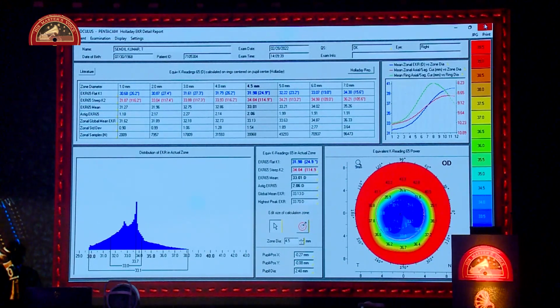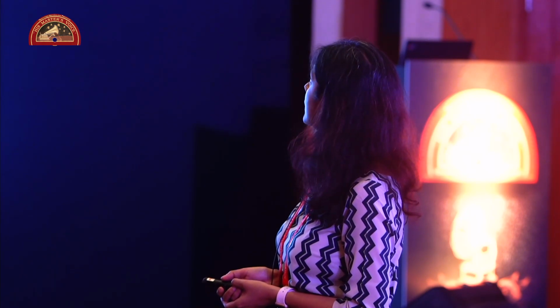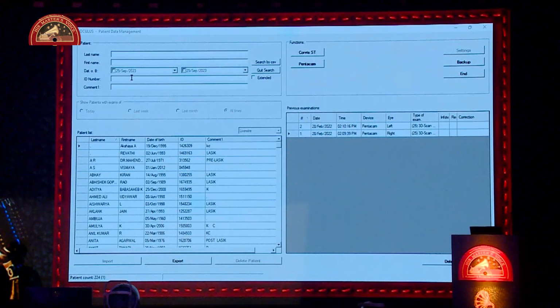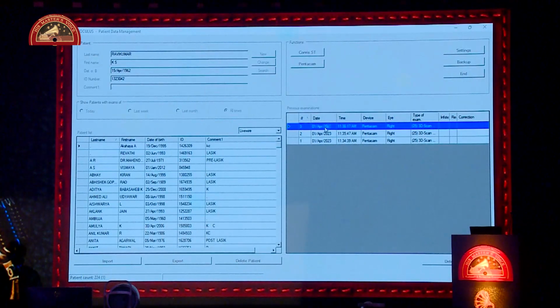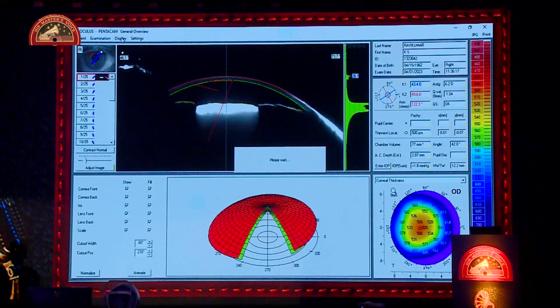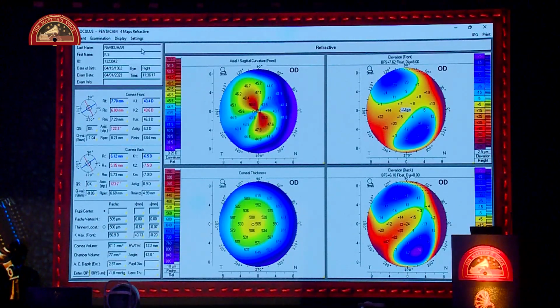Now coming to a case of keratoconus. In irregular corneas, the EKR map plays an important role to determine whether we can go ahead with a toric IOL power calculation or not. So in this case, the amount of cylindrical power, or the astigmatism, at the various zones, the difference was less than 1 diopter, and the axis was less than 10 degrees. So this becomes an ideal case to go ahead with the toric IOL power calculation. So this is a case of keratoconus.